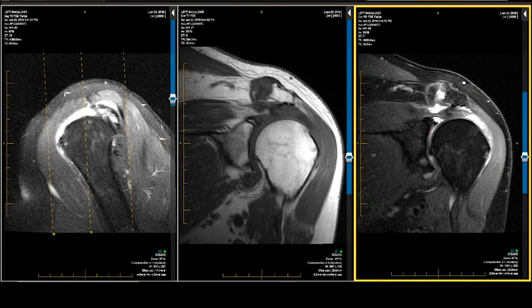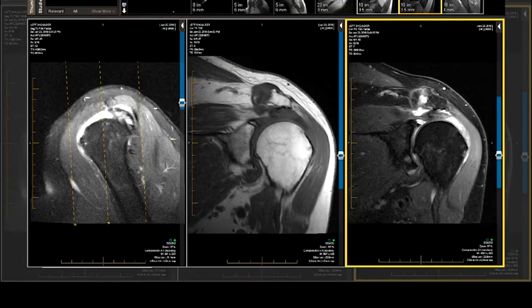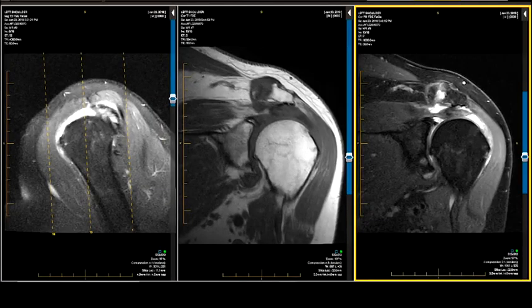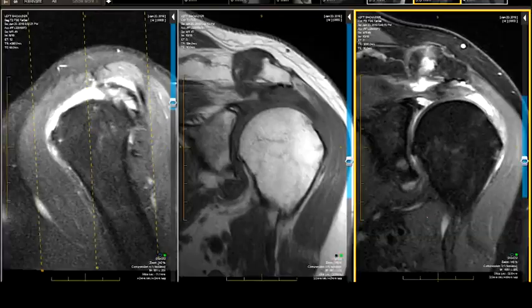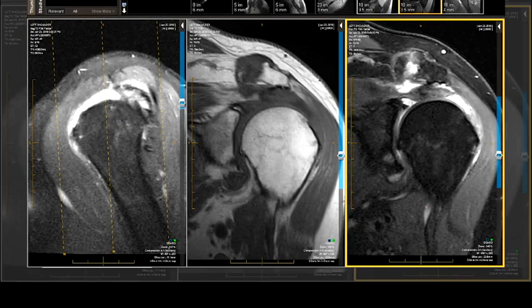So here's an easy one, a very gross example of a rotator cuff tear, 56 years old. Are we going to fix this? This is a huge tear. The length, first of all, full thickness, depth, full thickness tear. All right, let me make them a little bigger so it's a little easier to see. So now we're on yellow, and there's our tear. Wow, that is one big tear, all filled in with fluid.